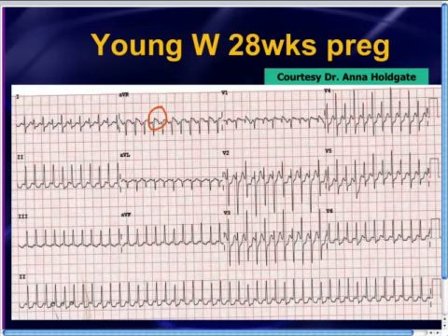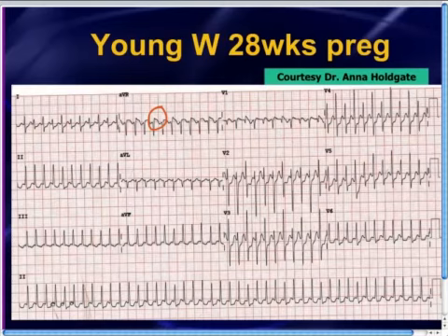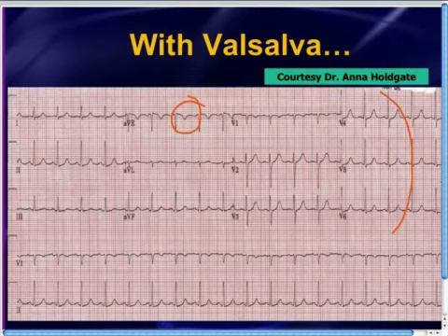So if a patient has ST elevation in AVR in the setting of an SVT, it doesn't mean anything as long as it goes away when they convert back to sinus rhythm. You can see the AVR ST elevation is gone, okay? So when you see ST elevation in AVR, if it's in an SVT patient, it doesn't mean anything, all right? So there's some nice pearls there.